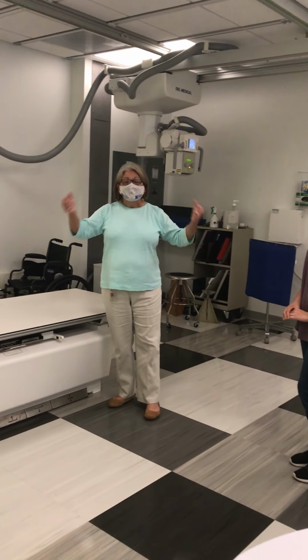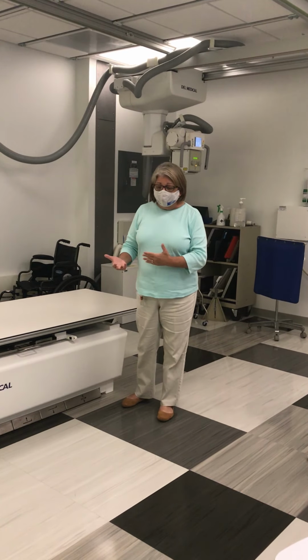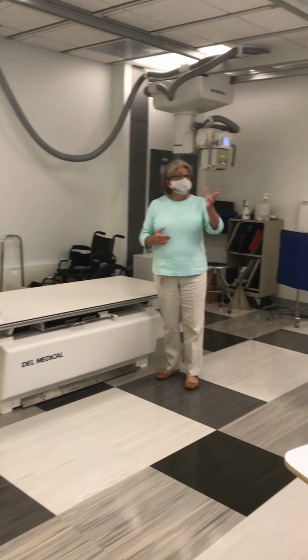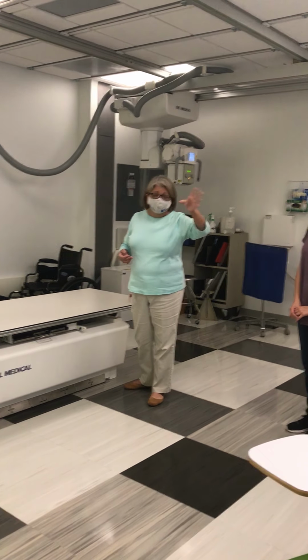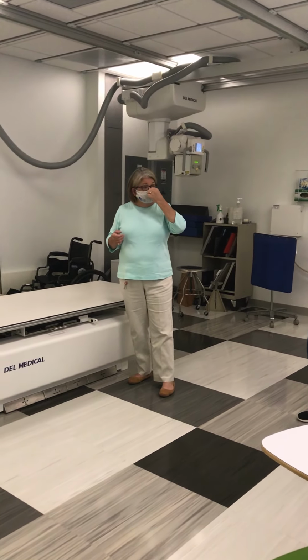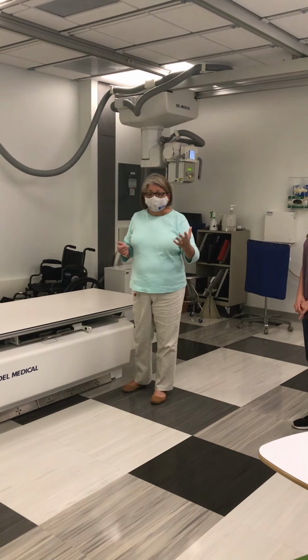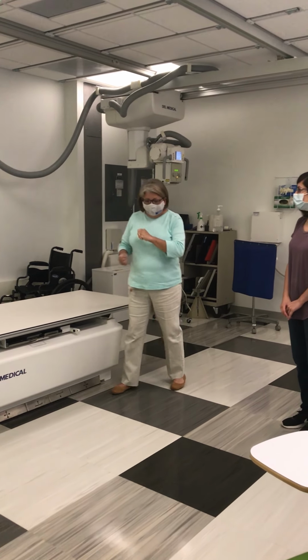Kidneys, ureters, bladder. It's named that because those are the structures that should be included on the image. Not necessarily that you'll be able to see those organs on your image, but they need to be included. This is the KUB. It's also known as the AP, the anterior-posterior abdomen. So we'll start with that exam.